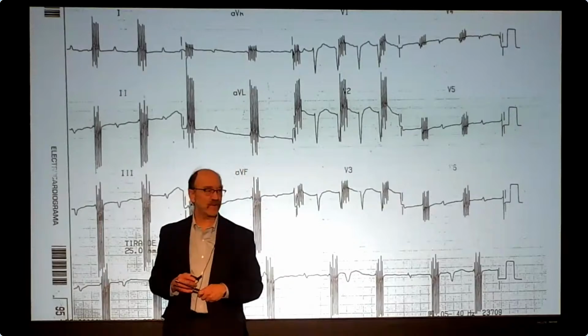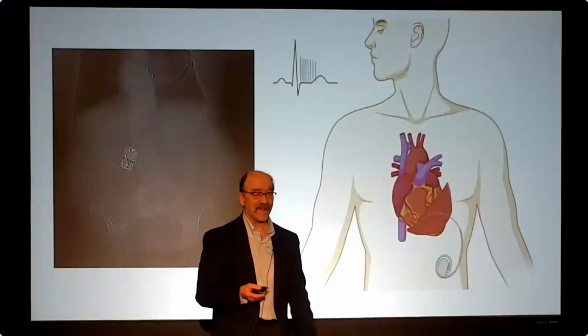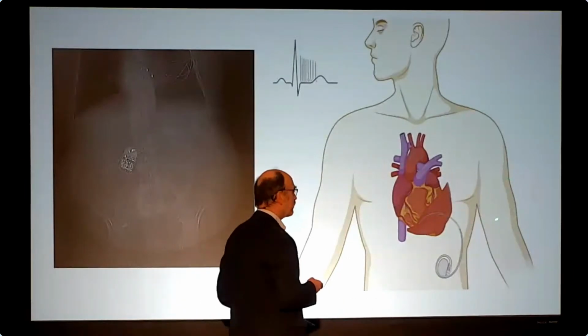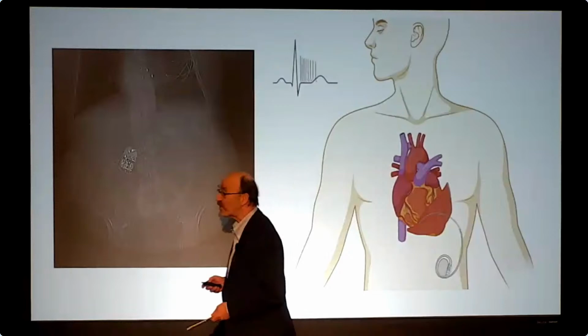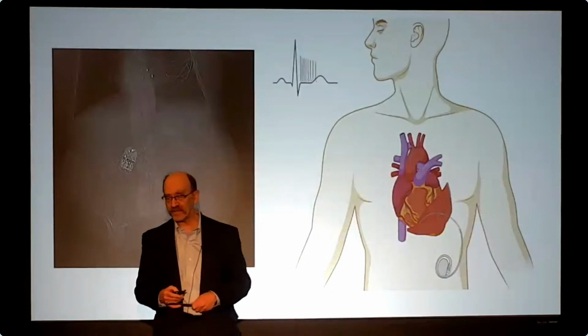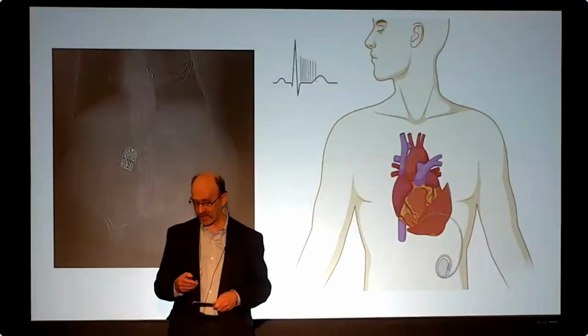therapy that was developed for congestive heart failure. Oh, come on. Oh, come on. I had to show one where, you kidding me? Cardiomyoplasty, skeletal muscle wrapped around the heart connected to a pacemaker. How well did it work? Didn't work so well. It was abandoned, but I thought you should see the EKG because life wouldn't be fun if we didn't give you a variety of spikes going all over.